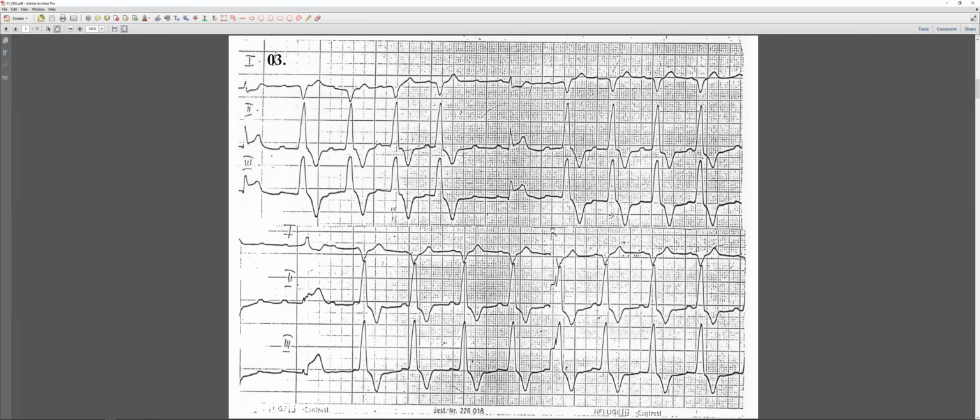Acute? No. What can you see? Only ST elevation, nothing else. Oh, okay, sorry. So it's not acute yet. It's before that. That's called hyperacute inferior MI. Hyperacute, sorry. Okay, well, I cannot give you anything for this.